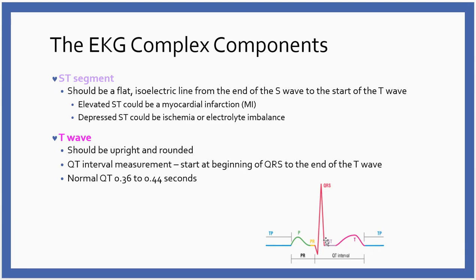Now, what if my ST segment was up here? Then I have an elevated ST segment. And although it can be other things, think heart attack, so STEMI. And so, you know, we need to do some more assessment of the patient.